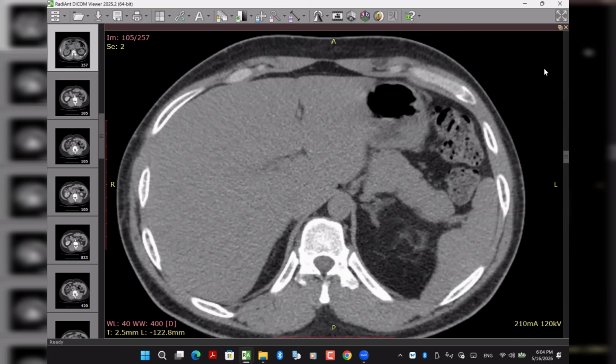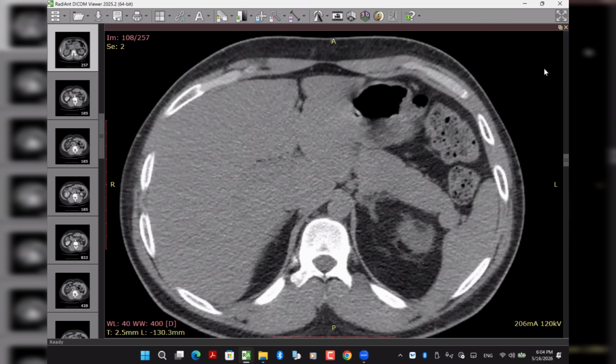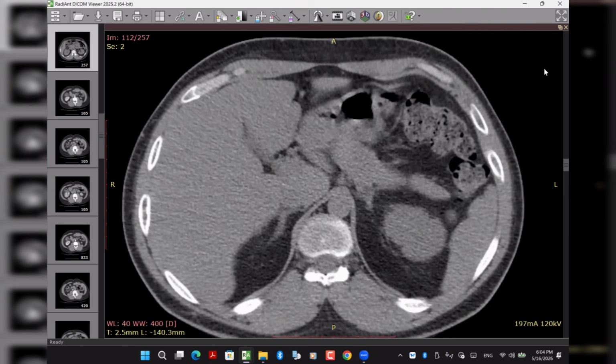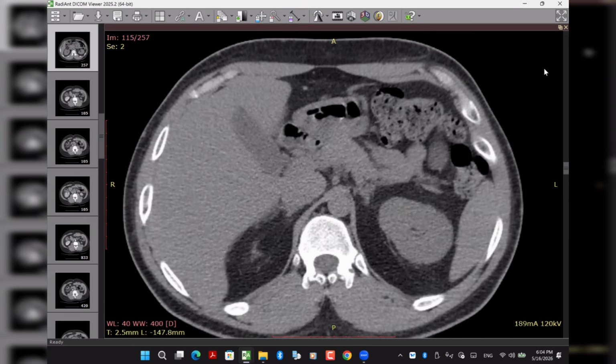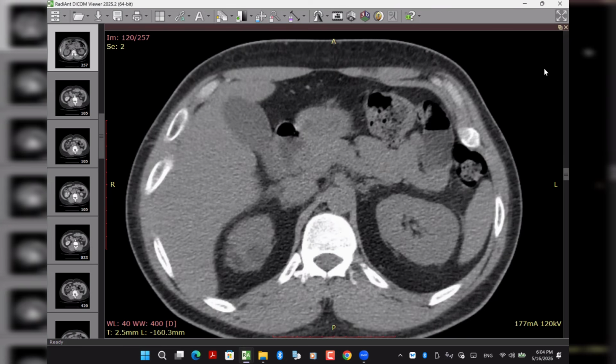So I'm presented with a CT of the abdomen and pelvis. These are non-contrast axial slices. Okay. I'm just going to try to scroll to the last cut before giving my comments. Sorry for the lagging, it's a bit slow. No problem.